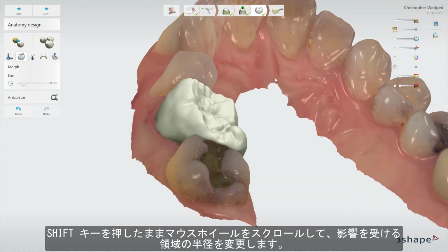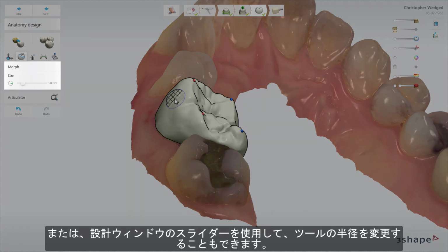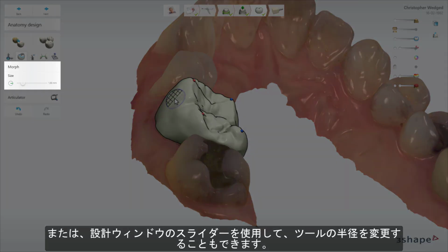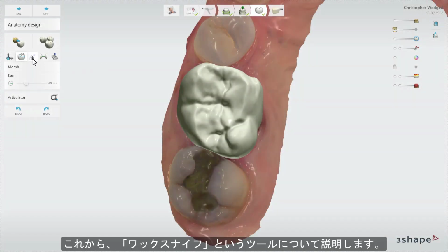Hold Shift and scroll the mouse wheel to change the radius of the affected area. Alternatively, you can also use a slider in the design window to change the radius of the tool. Let's move on to the wax knife.